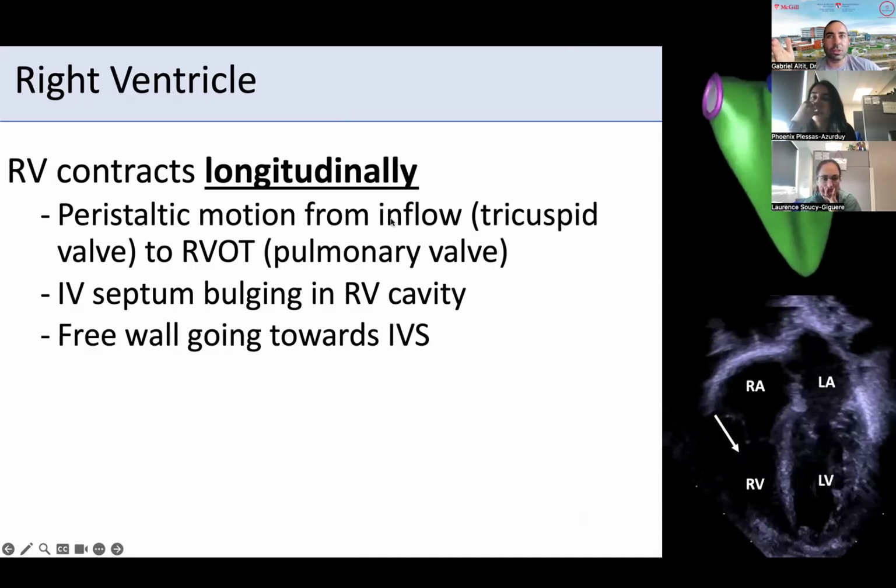For example, with pulmonary insufficiency, you're able to eject in your outflow tract, but if everything is coming back into your RV during diastole, then your absolute forward flow is diminished. So you get less pulmonary blood flow because of that. So patients with Epstein have a double hit. They sometimes can get a lot of pulmonary insufficiency, and they can get a lot of tricuspid valve regurg.